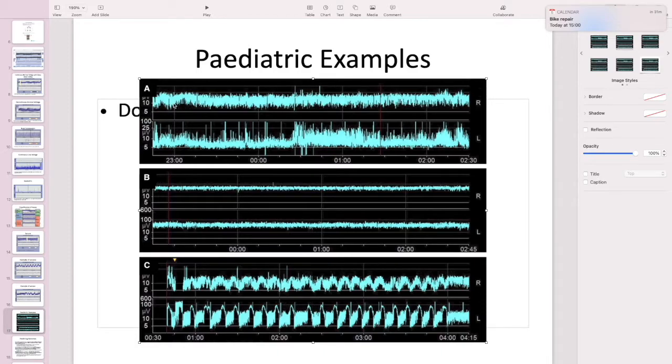So on the right side, lower borders above 5, upper borders above 10. There looks to be some sleep wave cycling perhaps, although not very much. So essentially, if I saw that, I'd say that's normal. But it is different from the left-hand side.